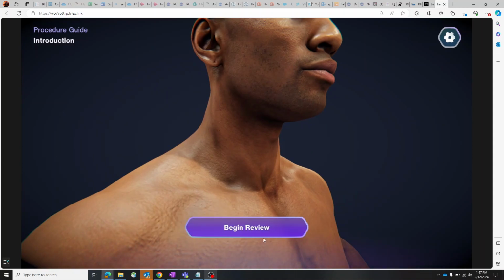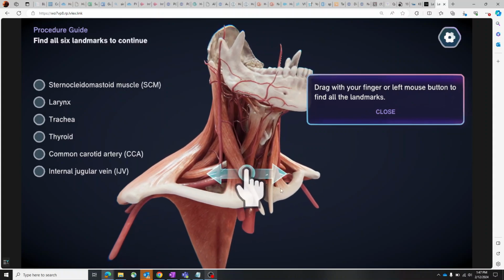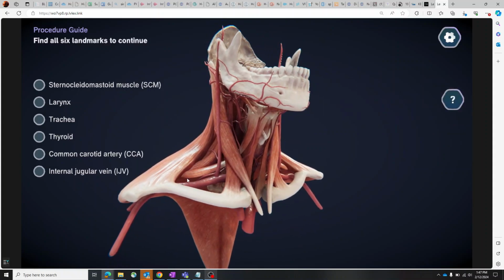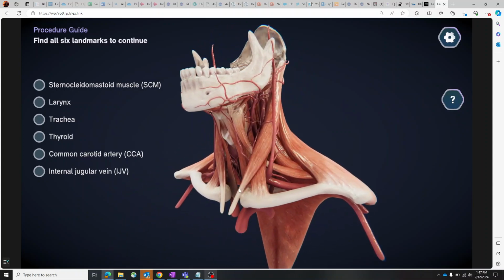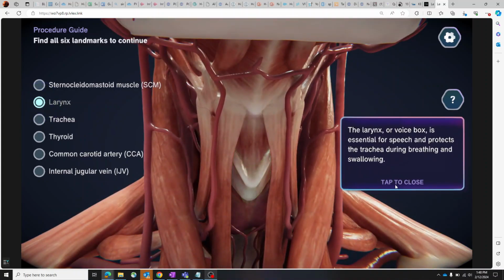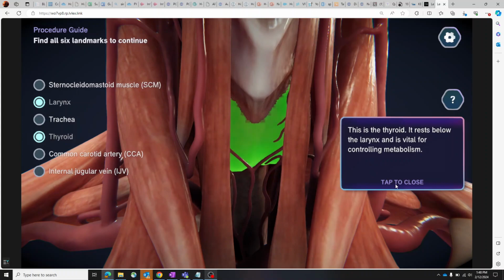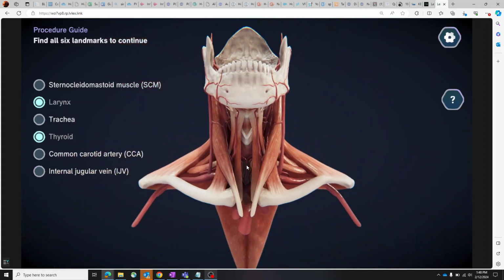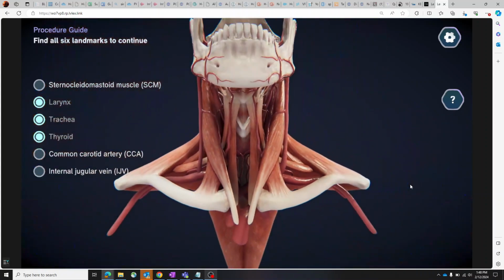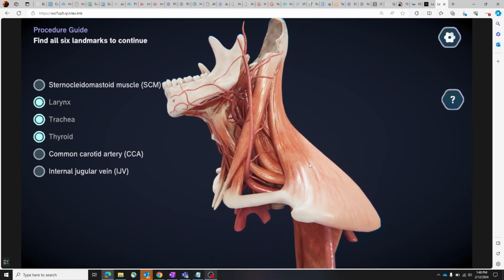Now we're going to find our position to do a longitudinal scan. Here we're going to rotate the probe to align the IJV across the screen. This is an on-screen indicator showing that at this point you're meant to take a recording of the longitudinal view. Now we're getting back into longitudinal view.